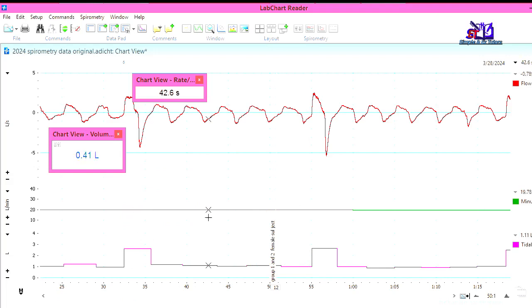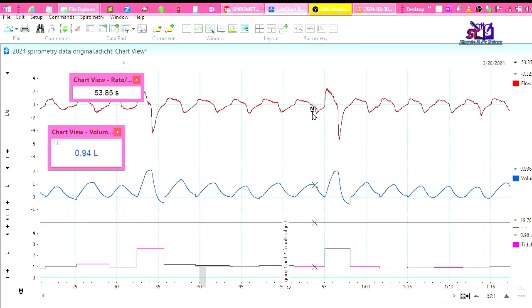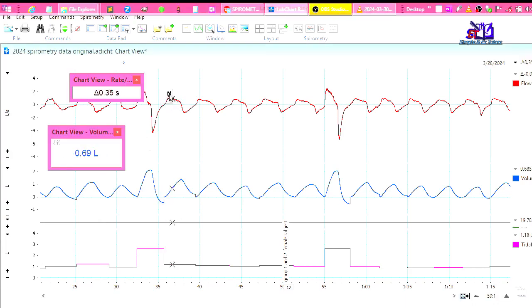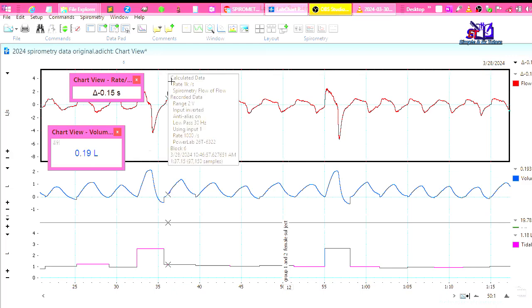to its original position. If you want to manually measure the rate of respiration, you can bring down the cursor. You either place it at the crest here, and then you go to the marker tool. This marker tool is going to mark that point as 0 when you look at the time. Before the marker tool it is in a minus, and when you bring it to the marker tool, you will see it start from that point as 0. You are going to select some of the data for 15 seconds.